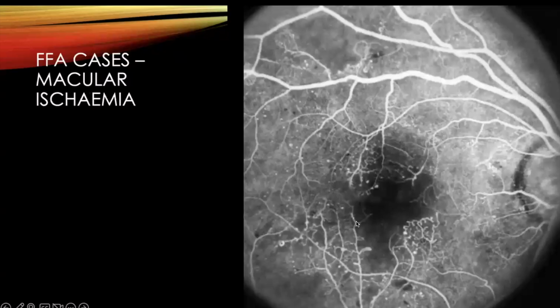But in this area here, you can see this foveal avascular zone is actually encroaching almost to half the size of a disc or even bigger, and that's much bigger than what you'd expect. And that suggests that this patient has some macular ischemia. And this is why a patient like this, I mean, you've got some potential IRMAs here, maybe some NVE, but this is someone who's perhaps a high risk non-proliferative diabetic. But this area of macular ischemia will probably be contributing to slightly lower vision than you'd expect given the clinical exam of the patient. And that's an important thing to note.